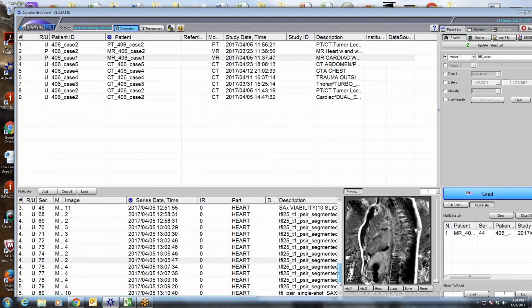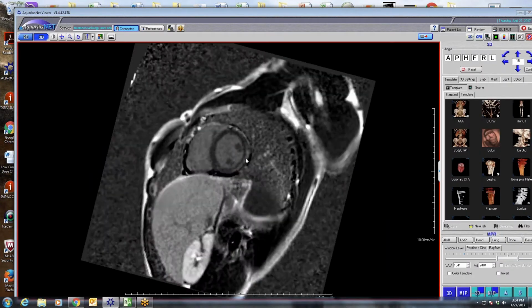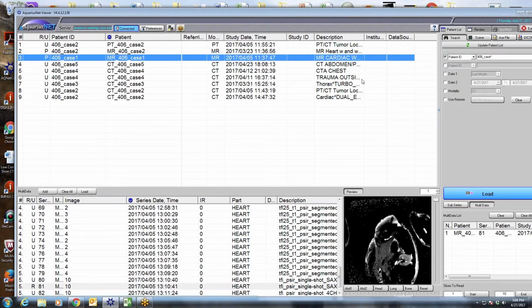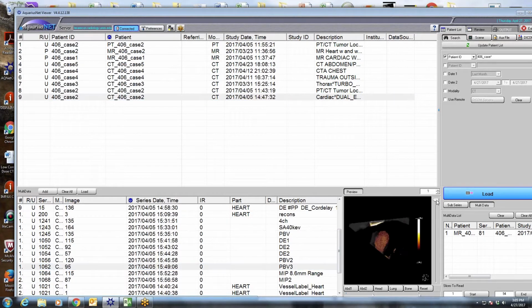But the cool thing about this case was, even though this was the most classic case of myocarditis, and you can see this subepicardial enhancement all over the place, with a classic history of a viral illness and then chest pain and a big troponin bump, the peds cardiologist wanted to exclude a coronary anomaly, which to me is kind of insane, but they were pretty adamant about it.